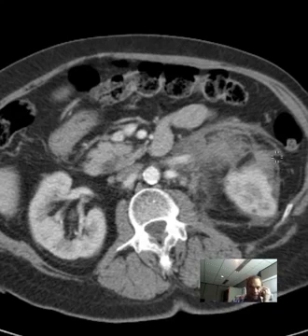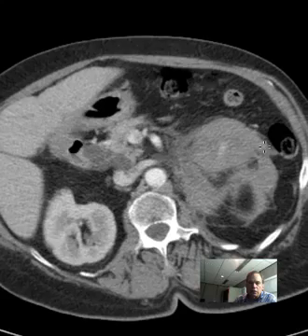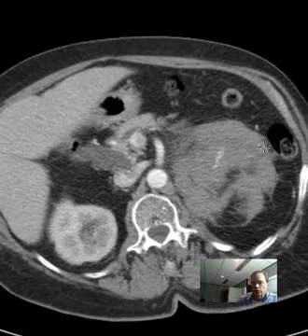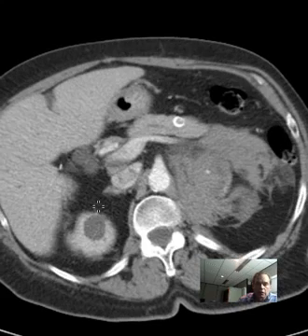You see how there's blood within the confines of this fascia, just like you see the fascia here, with just a little bit of narrow fat plane. Here you see this blood also largely within the confines of this fascia. So what would be superior to the kidney that might hemorrhage and still be in the perirenal space would be the adrenal gland. And let's look over on the left side.